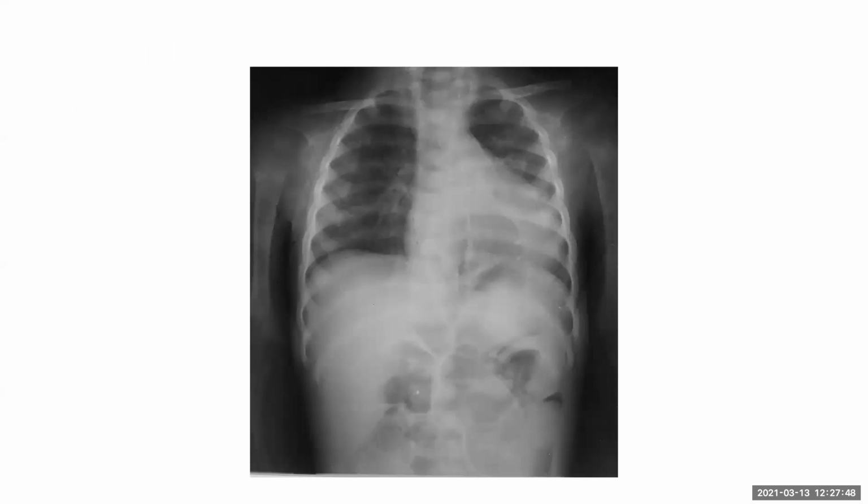This is a frontal radiograph of a child with repeated cough and fever. The striking abnormality that I'm able to see is air lucency projected over the left cardiac margin, with some septation in between. I'm not able to appreciate the left cardiac borders clearly. The left hemidiaphragm is obscured. I don't see any pleural effusions. The rest of the lungs appear normal.